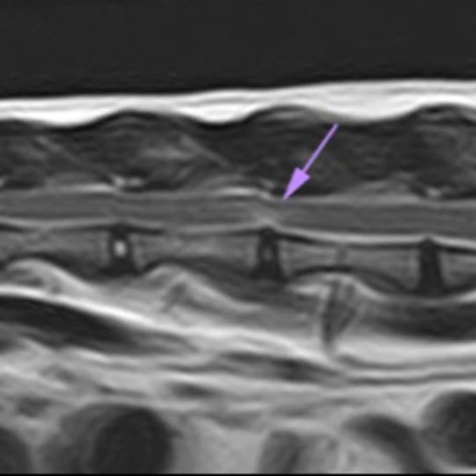Interestingly, none of our cats was affected by intervertebral disc herniation in the cervicothoracic spine. Likewise, there was no report of C6-T1 disc involvement among all published feline cases. So this low susceptibility to intervertebral disc herniation of the cervicothoracic spine could be related to the range of motion and stance configuration of the feline spine.